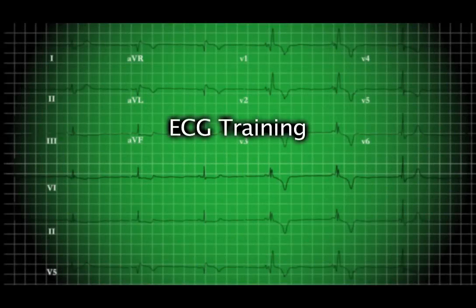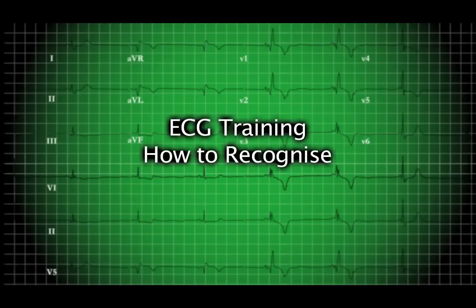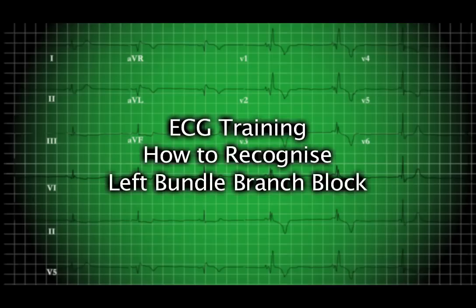Today's ECG video training is on how to recognize left bundle branch block. It's very important to be able to recognize left bundle branch block because it does affect your protocols, it affects the patient's symptoms, the patient's outcome. It's a very important skill to have.